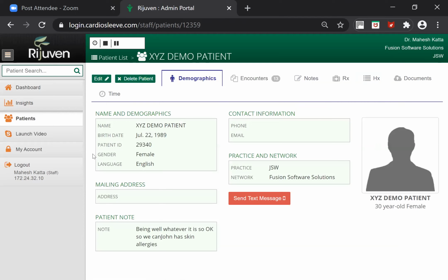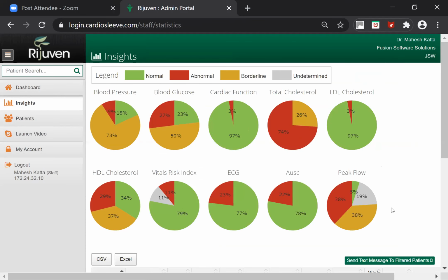And coming to the medical intelligence, I'm going to the left-hand side. I'm going to insights, where you will see all this medical intelligence. For example, a doctor has 500 patients, or a village, or a factory. Once all the 500 patients are on the screen, if you click BP, you get all the BP.